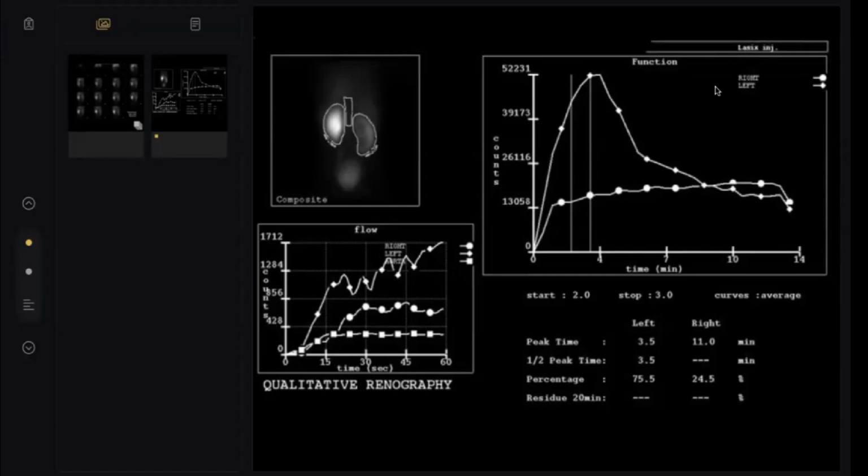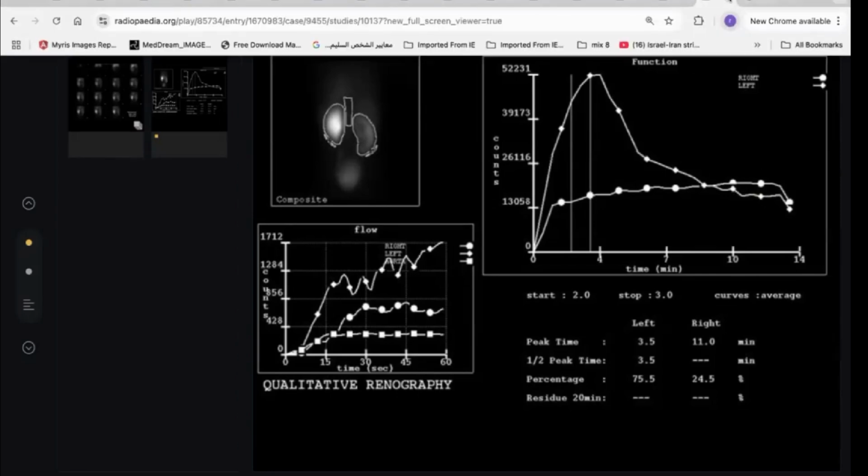See here, my colleagues, I think here he gave Lasix. What happened here? The normal one excretes more, but the abnormal one is still in plateau. No effect here. Okay, my colleagues, Lasix is here. See, the abnormal one shows a persistent plateau. The normal one, more excretion. Thank you, doctor, so much. Next candidate.